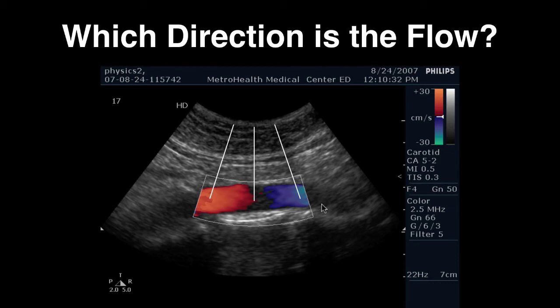I won't say what it is at this point. And here we've got our curvilinear transducer, and you've got up to 256 crystals here that are independently firing, and because of this curved array, they're firing at different angles.